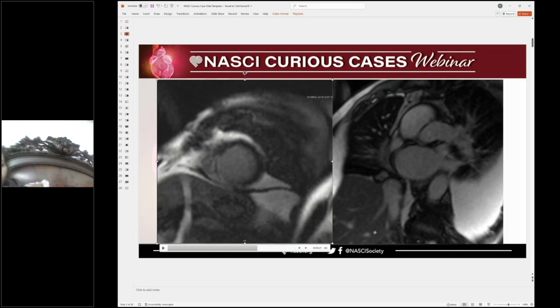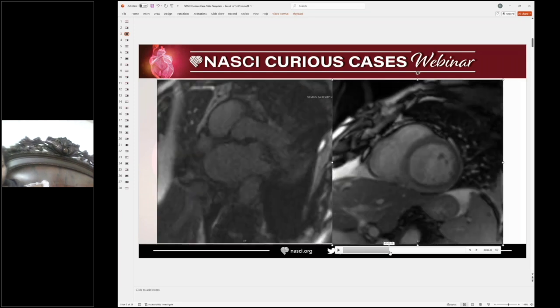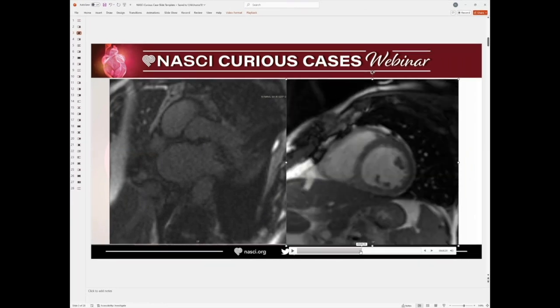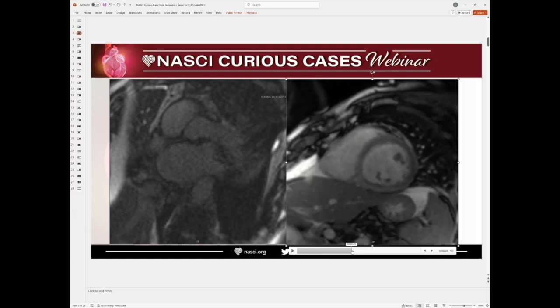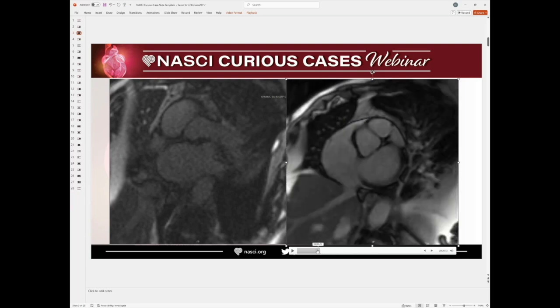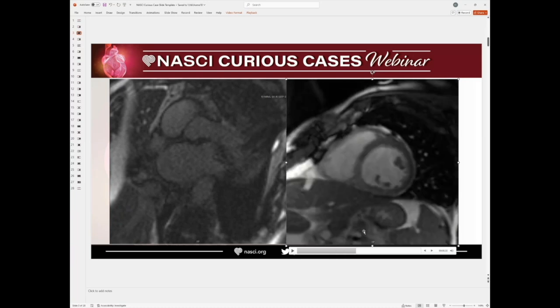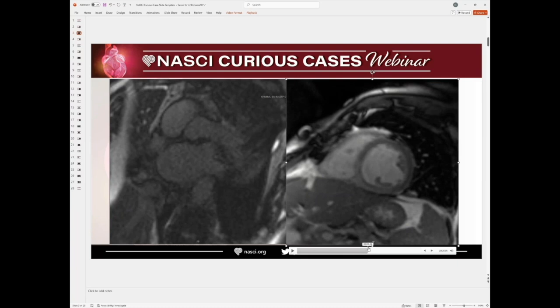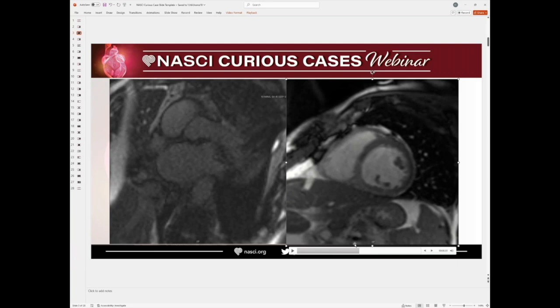And then I guess this one was the SSFP. I wanted to show you this. This is a beautiful sequence showing you, since it has the T2 weighting, and this is acute/subacute MI. This is the fourth day of the MI of this patient. You can nicely see the edema here. It's so interesting because most of the time when you have a patient with chronic MI, you're not going to see the edema. You will see thinning and hypointensity. So that was beautiful. I didn't see many cases like that. As I said, we're not getting acute MI, subacute MI patients on MRI most of the time. This was just one case, and then we will continue.